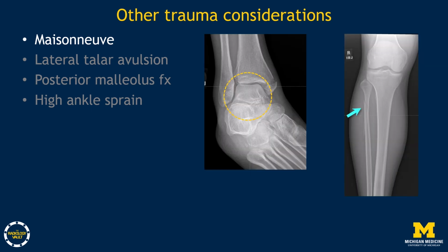The ankle and associated ligaments form a ring structure as demonstrated. A ring rarely breaks in one place. When encountering a transverse medial malleolus fracture, always look for the fibular fracture.